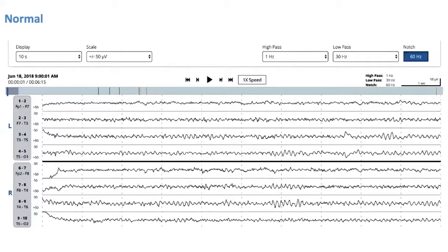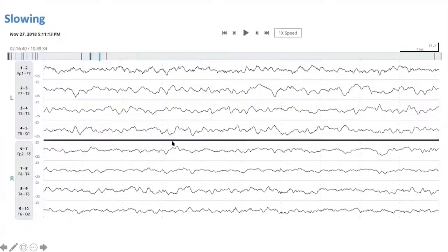So is it fair to say that looking at the EEG, you can think about basically the horizon in the ocean, not too many drastic departures from baseline. It's kind of quiet. And you see in the back of the head this rhythm that is beautifully sinusoidal in shape, in the 8 to 12 hertz range. You know that the state of the union in this particular brain is fine. Correct.